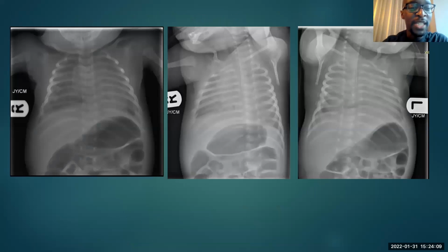So when you see this, let's pretend it was a chest X-ray from your A&E reporting pile, and the clinical question was shortness of breath, query infection, and you see these rib fractures. Then you need to trigger the safeguarding protocol, and I'll elaborate that in a minute. When you do that, that's when you get a skeletal survey.